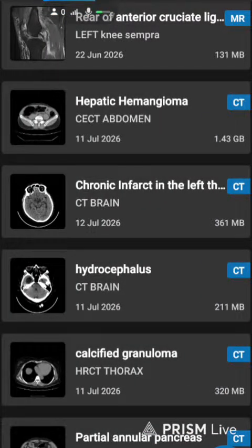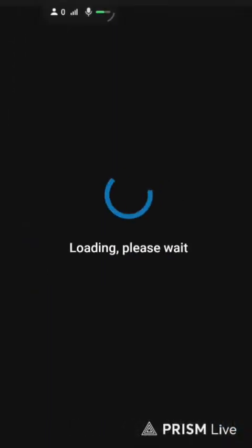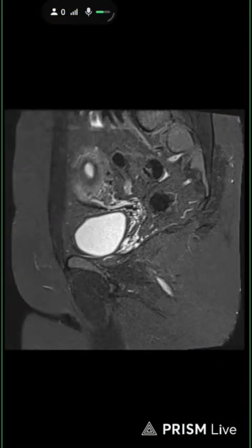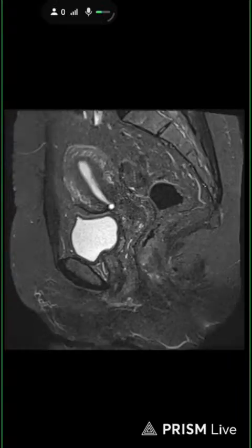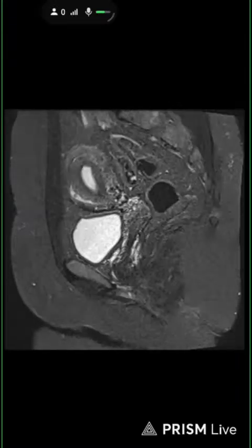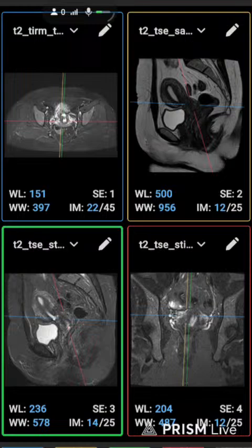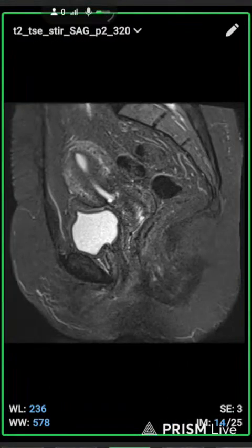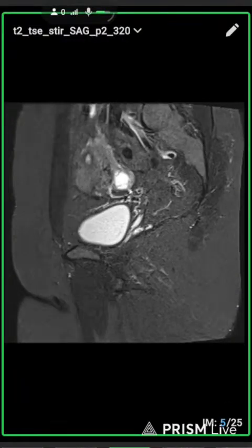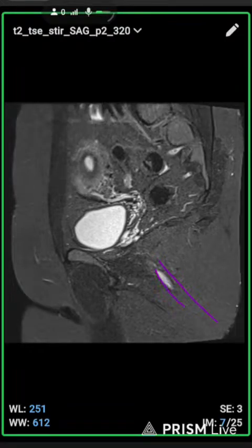So the next point is about MRI fistulogram. Here you can see in this MRI image the patient has some type of movement, so it appears jumping. I will show you the sagittal image. So here you can see the fistula moved in this direction.